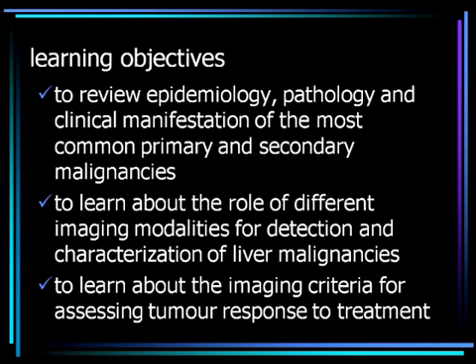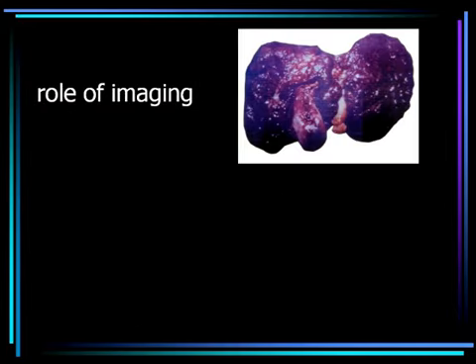Because we as radiologists, we are not working for ourselves. We are working for the clinicians. So whatever we do, we need to persuade the clinicians that we are right. So what is the role of imaging? You see here a cirrhotic liver.